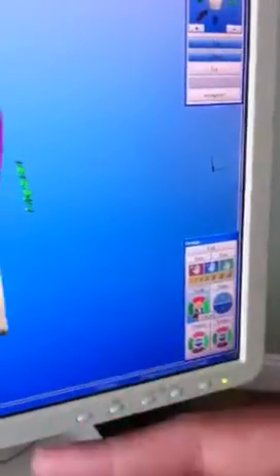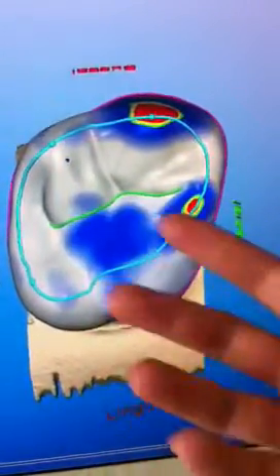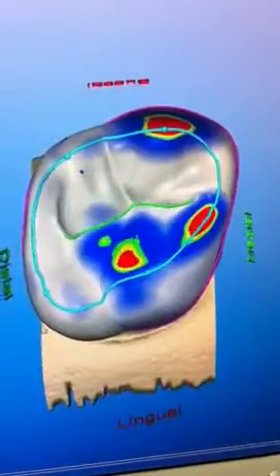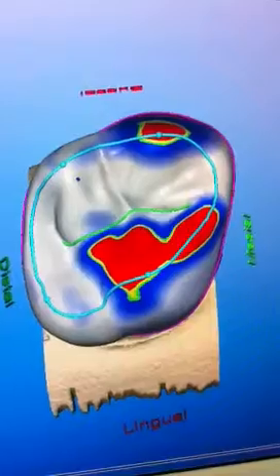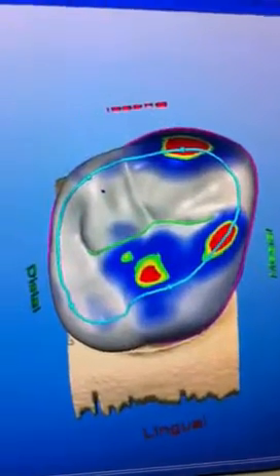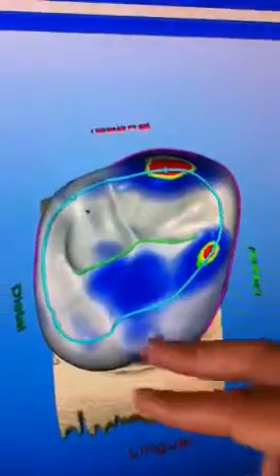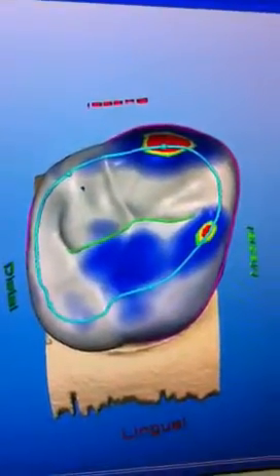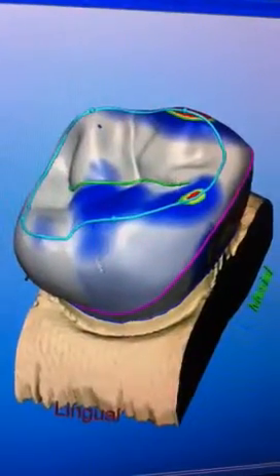Watch, whenever I click on the occlusal part, see how it's bringing the tooth structure up, making the contact stronger. You can bring it all the way up if you hold it down. See how much I raised that. It's definitely crushing up against the opposing. Then I'm bringing it down back to cervical, so I'm taking the contacts away. But that's one large area, or quadrant, of that tooth. If you look from the side, that's the whole quadrant it's adjusting.